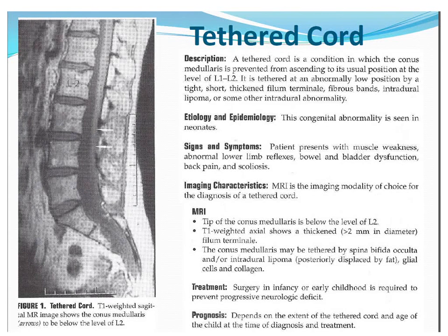And ultrasound is pretty good for finding the level of the cord, making sure that it's not tethered or stuck posteriorly. You see how this is also stuck posteriorly in the canal instead of just kind of floating down in the center of the canal. So that'll show stuck posteriorly, not moving normally, and it may show thickening of the filum terminale that is preventing the cord from ascending.